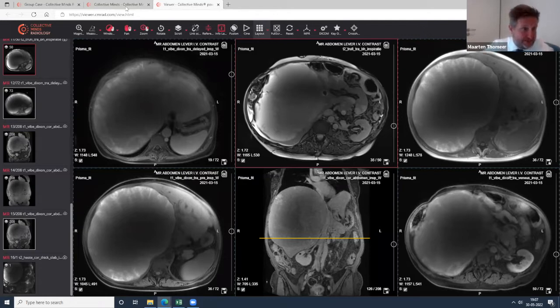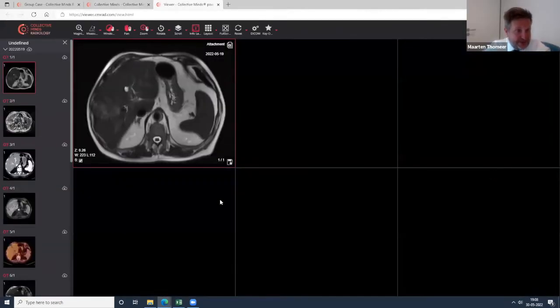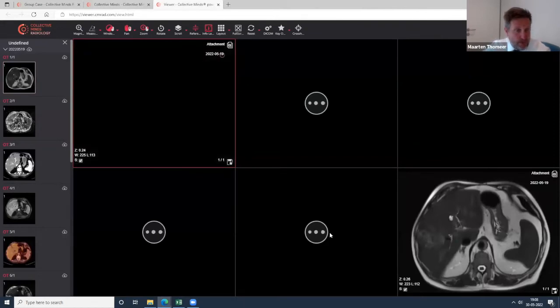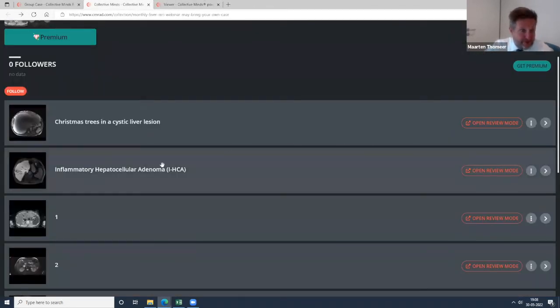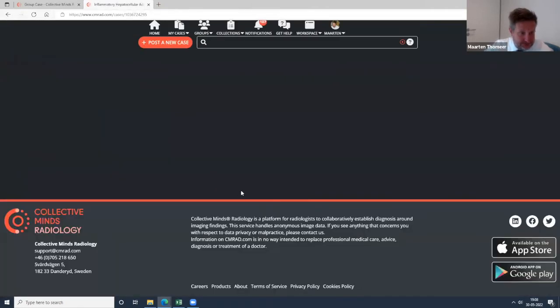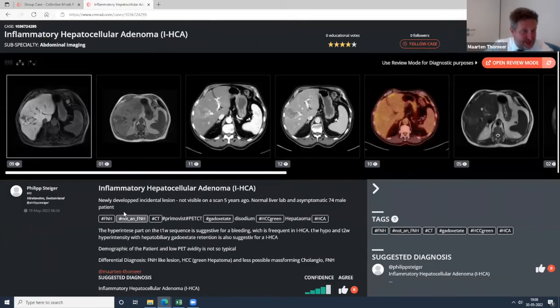Okay, fine. Let's go to the next case. Is that okay for you? Absolutely. So the next case, there seems to be a diagnosis on it, but I'm not sure if it is the right diagnosis. But let's go to the case. So I presume it's a young... Do we have more information on this case? A newly developed incidental lesion in an asymptomatic 74-year-old male.